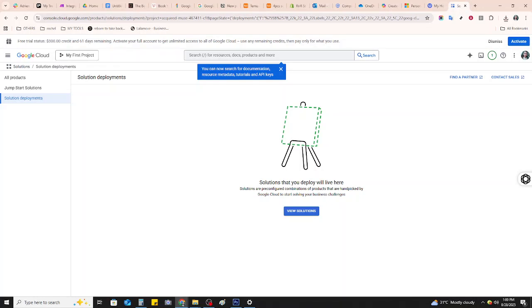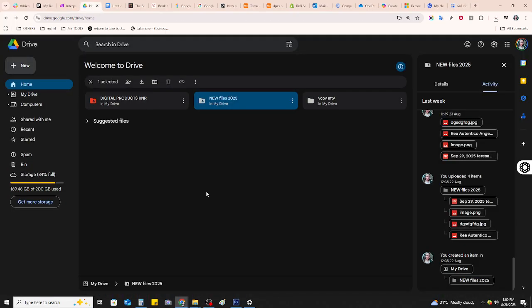In today's video, I'm going to teach you how to insert and process an MRI DVD on your computer. We'll work through each step to ensure you can easily access and manage your MRI scans. So let's get started. First, let's begin by inserting the MRI DVD.